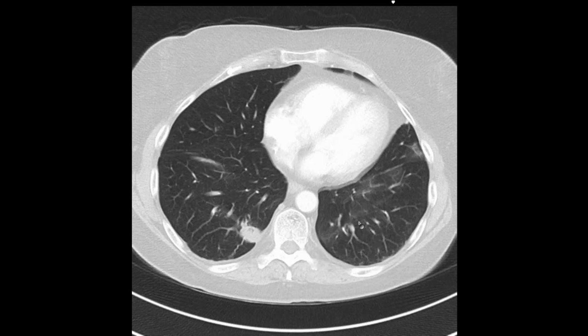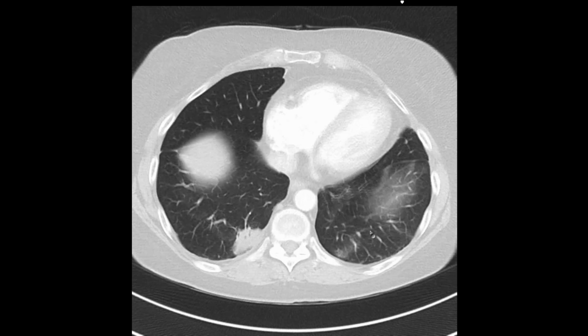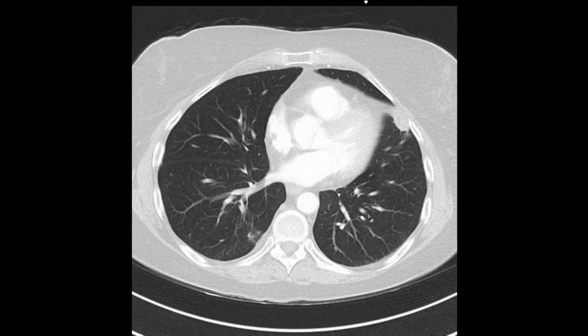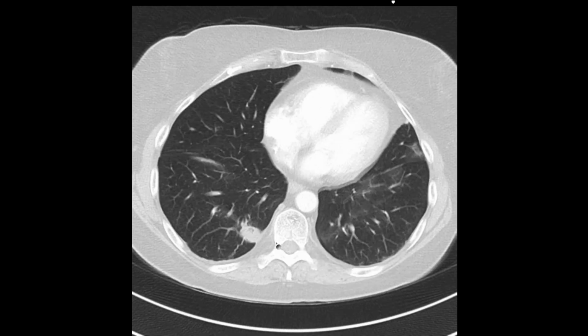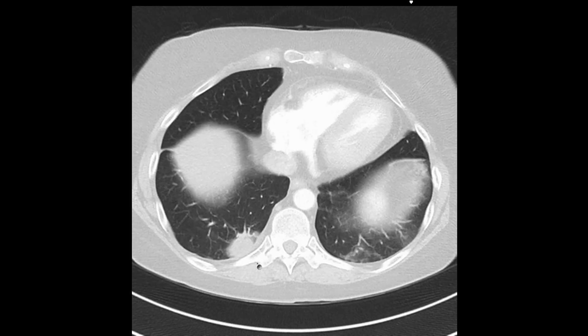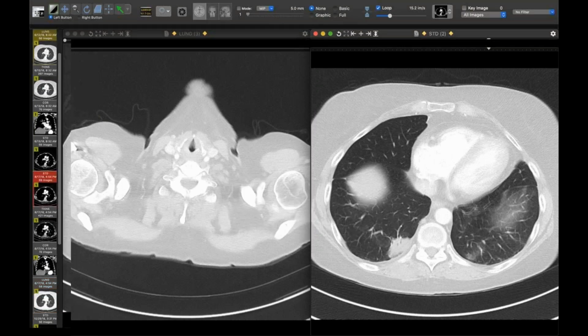Okay. So this is a patient on a follow-up exam, an unanticipated finding. It's a follow-up in an oncology patient, I think a gynecologic malignancy. So the opacities that I'm showing you here were unexpected. There's one in the lingular division. There's one here, somewhat rounded, but this one certainly is quite large, and it's quite irregularly shaped. So I'm going to bring up the CT that goes along with that.